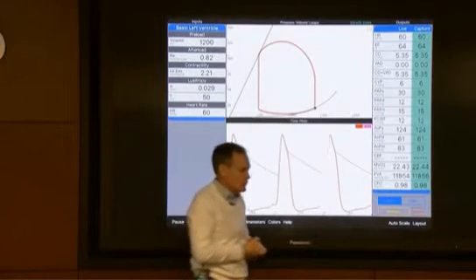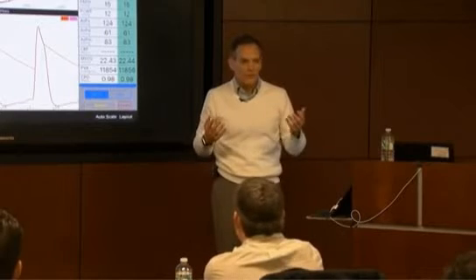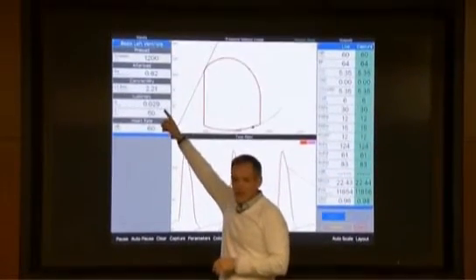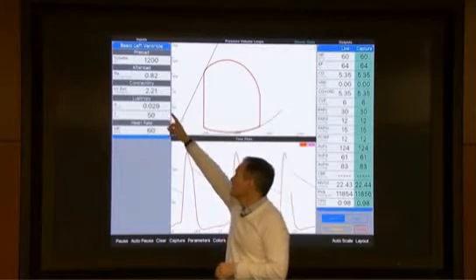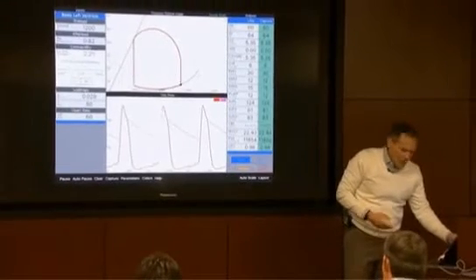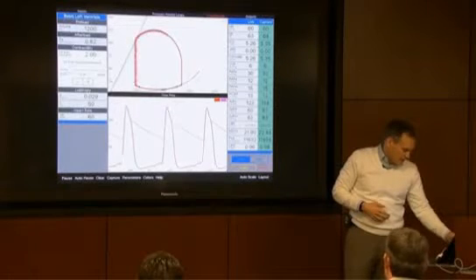All right? So we're talking about contractility. So let's make a change in contractility and see what happens. Now, it's a simulation, so I have a way of just numerically going in and changing the contractility number. You see an input there labeled contractility. It has a number of 2.21, but I'll decrease it. So I'm going to hit the minus button, and I'm going to decrease contractility.